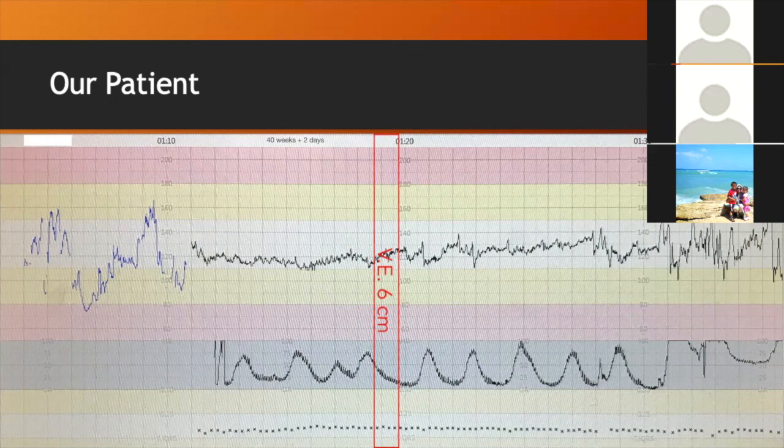Yeah, okay. Contractions, so they appear on the toco bar, yes? Okay, what does the toco bar actually tell us? What can we measure from the toco bar? The frequency of the contractions, not the strength, okay? Duration, maybe, but not necessarily. You still have to have your hand on the abdomen to feel that, okay? And it can give you an idea whether there is normal tone in between, or is it actually settling or not? But again, that has to be a palpation more than just looking at the trace. It's mainly the frequency that you may be able to actually tell. If you're not picking it up properly, you can't even tell that.